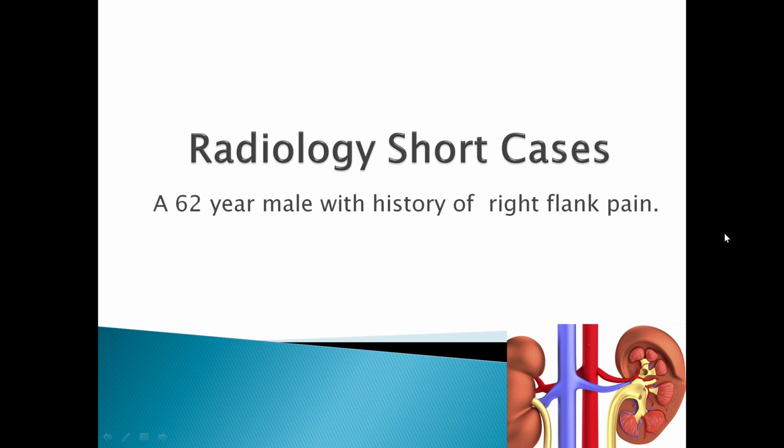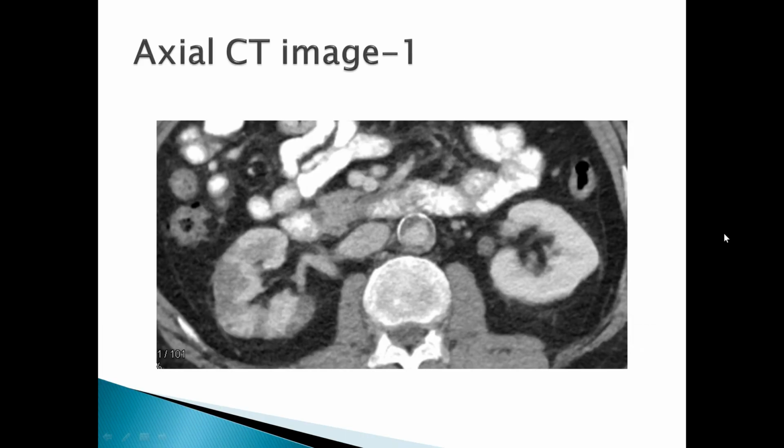Today we have a 62-year-old male with history of right flank pain for the past few days. Patient was advised CT of the abdomen. So this is an axial image which is taken at the level of the kidneys.